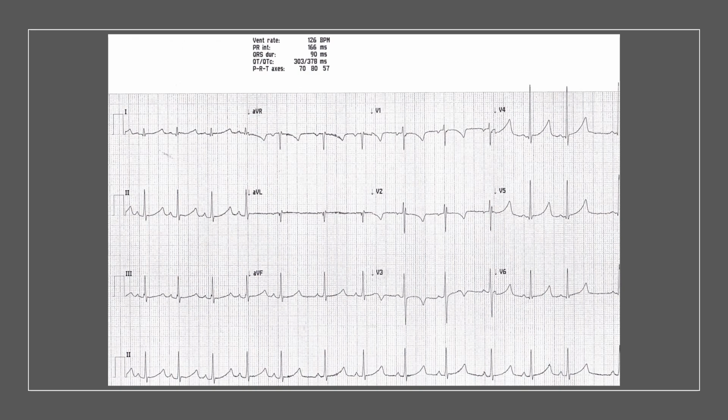This was her ECG. I don't know how you feel, guys, but many of us, especially those of us who work mainly on the adult side of the ED, find seeing kids quite scary.